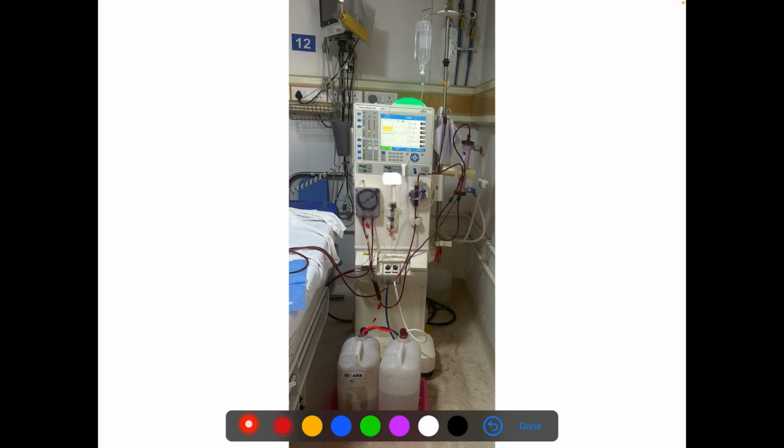Okay, bicarb solution and acid solution, they go into the machine, they get admixed with the water from the RO circuit, which is back side, and thereafter getting mixing and preparing a dialysate solution that is infused across the, sorry, this one. Okay, this is that is given into the dialyzer. So here the exchange takes place and the ultrafiltrate or the waste fluid that is collected is sent from this into the drain. Okay, so this is what your dialysate circuit is.